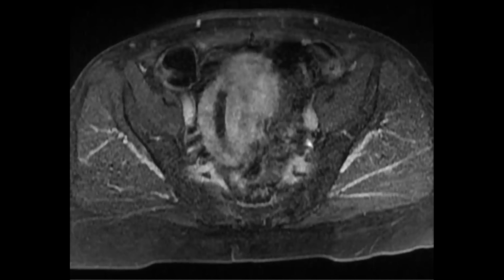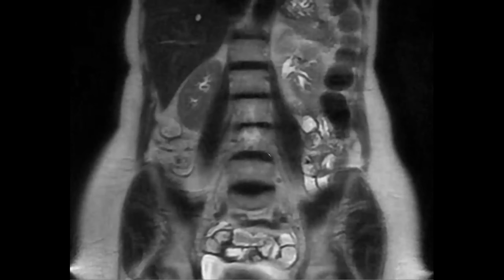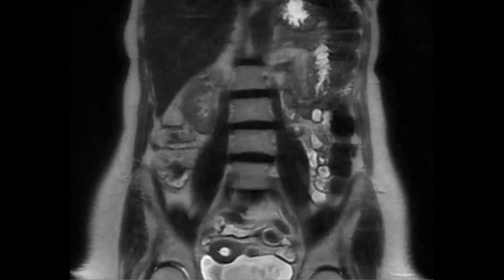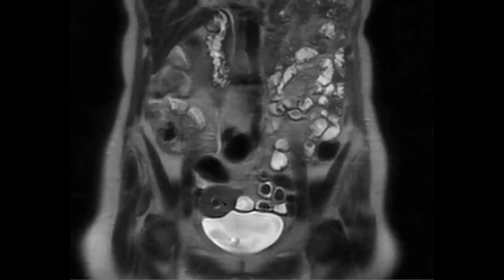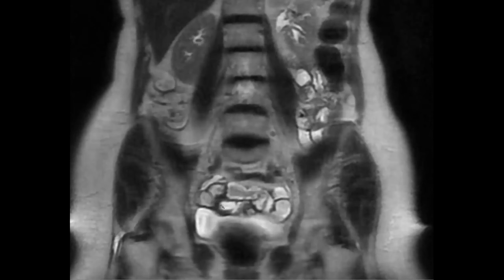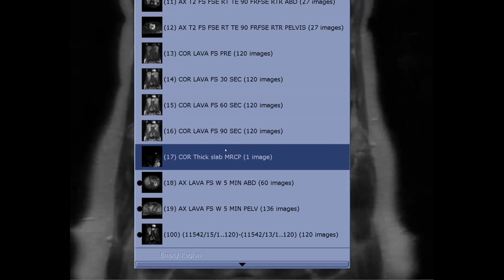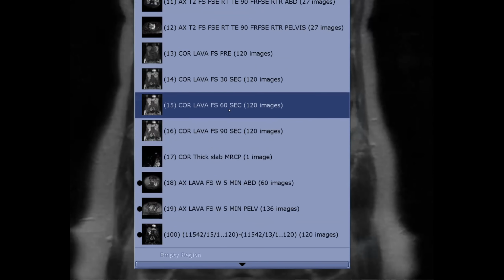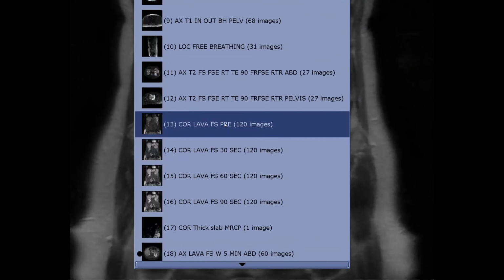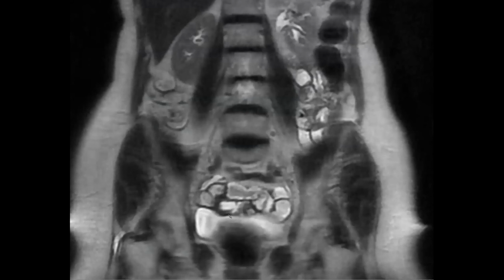It's really thick though, right? It's quite thick for Crohn's, and here it is. It's almost like mimicking a uterus. But anyway, so this was long segment thickening with homogeneous enhancement of the wall. And let me just see if we have a... No transplant, right? No. What were you thinking about? No, I was just thinking lymphoma, weirdo stuff. Yeah, like PTLD or something.